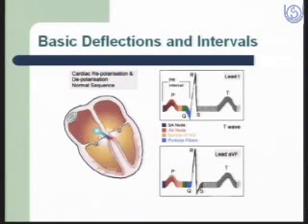So the PR interval depicts the interval between the onset of P wave to the onset of QRS complex, that is from the onset of atrial depolarization to the onset of ventricular depolarization. So it depicts the time it takes from here till it reaches the ventricle. So this is the whole lot of time, and it is depicted by the PR interval.